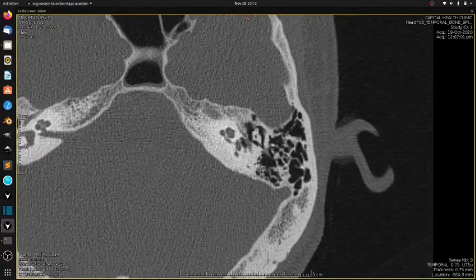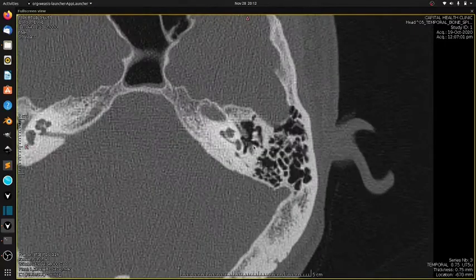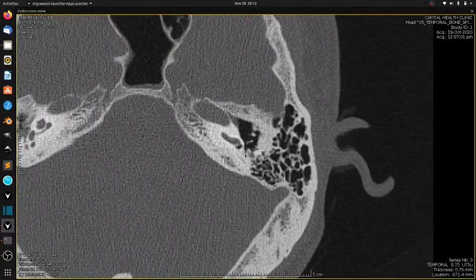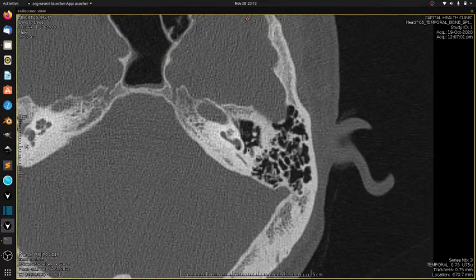Now in this middle ear let us see the posterior part, coming from superior to inferior. After the ice cream cone you see some depression. This is the basal turn of the cochlea, and this projection that is projecting into the middle ear on the medial side is the promontory, and this depression that you see is the sinus tympani. The elevation that follows, just lateral to the sinus tympani, is basically the pyramid, and after this elevation you see another depression, and that is the facial recess.